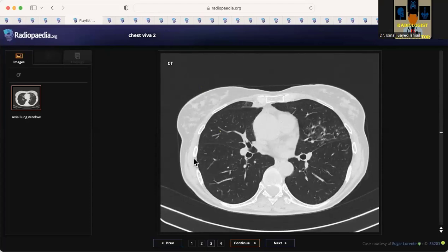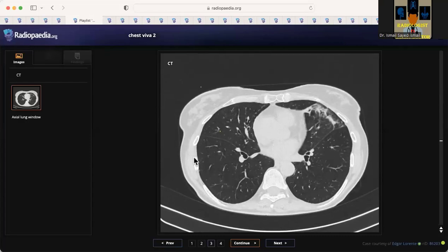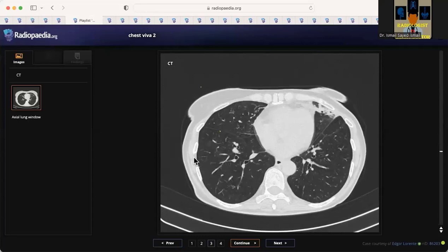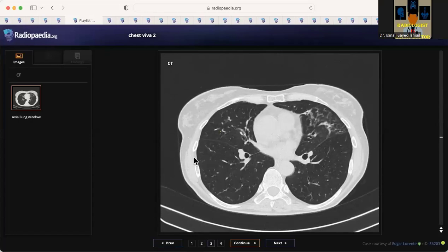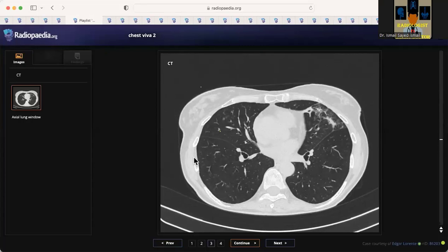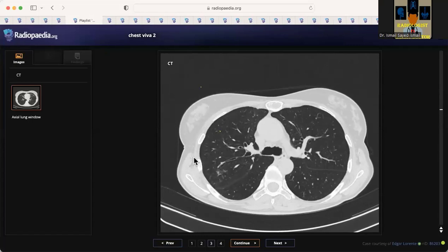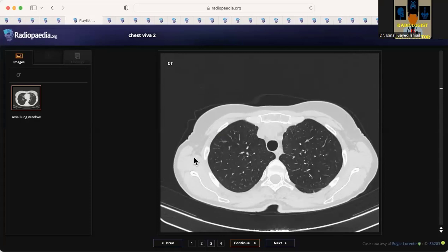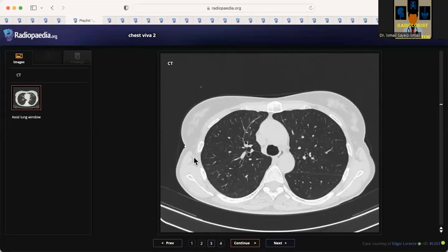Actually, the medial aspect of the right middle lobe demonstrates consolidation. There are also lingular bronchiectatic changes, and maybe tree-in-bud opacity seen at a few sites. So I'm thinking that this is atypical mycobacterial infection because of the characteristic location. So there is tree-in-bud and the pattern of involvement in the lingula and right middle lobe.